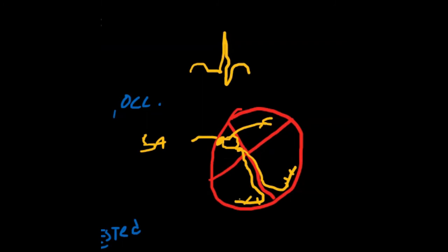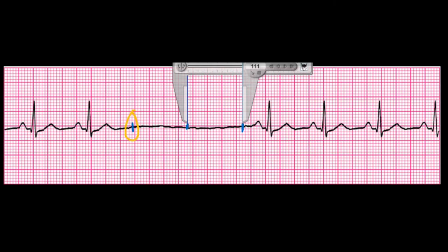Horrible drawing, I know. But the issue that's actually occurring here is that, don't forget that here is the AV node. And if you recall, the AV node is to be a backup pacemaker. What do you notice has not happened up here? Here is where a P wave should have been. There should have been another one here. For whatever reason, the SA node did not fire. It did not generate a P wave. And in this case, the backup pacemakers did not kick in either. So there was a complete sinus arrest. Nothing happened. This is usually what your big concern is.